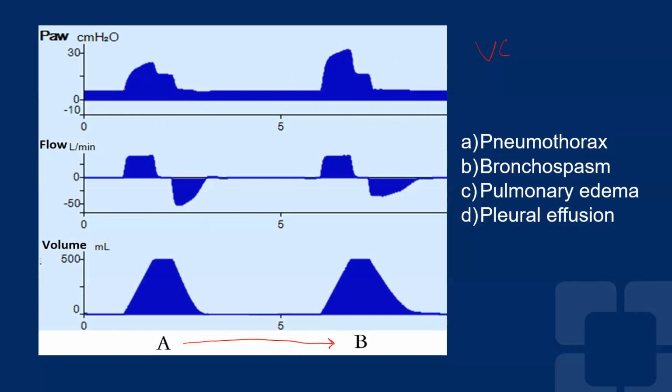So what I want to show to you is, well, let's talk about the trigger. Remember we said that the reference signal is the patient. So the patient breath started right here, right where I'm putting the arrow, which corresponds to around this point. That's where the diaphragm started to activate with electricity. And even if we didn't have this electrical activity, you can see that the flow at that point crossed the baseline, or it's at the baseline, just superimposed on the baseline.